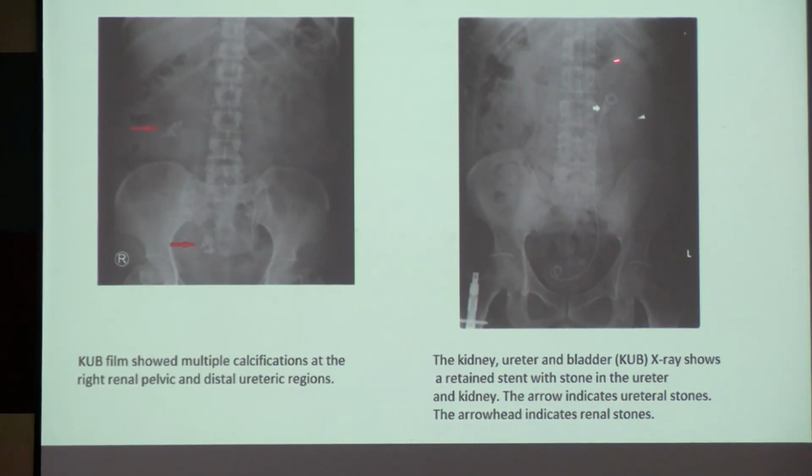So this is basically a tube that you can see with two ends, a double J. So it's a double J stent. And where do we place these stents? These stents are normally placed post surgery. Whether it is a kidney stone or a ureteric stone, we place these stents. Post pyonephrosis, we want to drain the pus. Post ureteric stricture, we want to dilate the stricture, we want to dilate the whole length of the ureter, so we place a stent. You know, a stent is also placed in the heart.